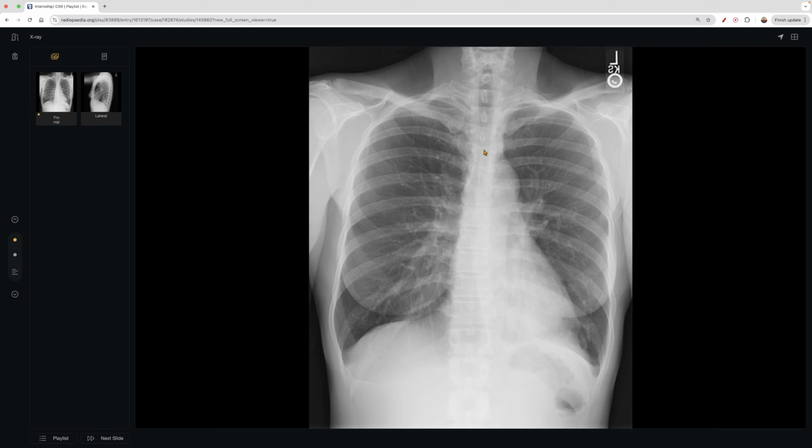And then we come back up and go down, and we can see that the right heart border is somewhat displaced. So we would do a full chest radiograph quality checklist. We would do our due diligence and check to make sure they're equidistant. And you can tell perhaps that's a little bit more skewed. Even just the positioning of the patient looks a little bit different. But nonetheless, and again, appreciate here the breast tissue, right? Because you can see how it looks here and then right below it, this looks much more dense than it does down here. And again, that can make it look like there's pathology when it's actually not.